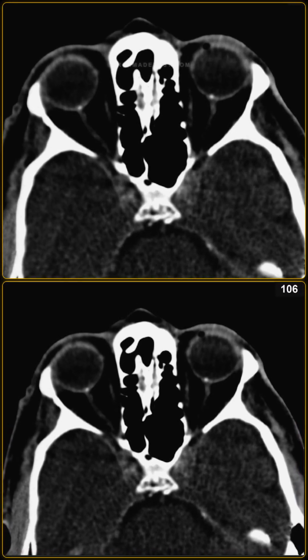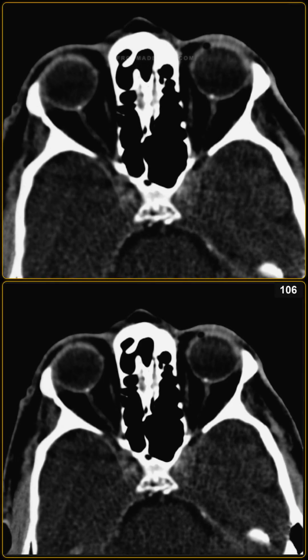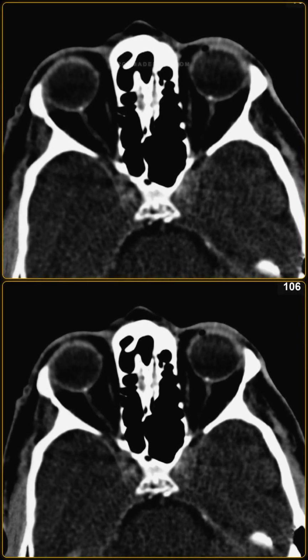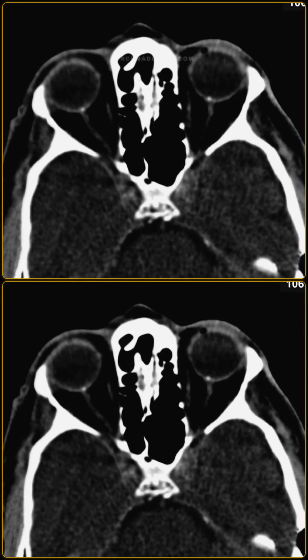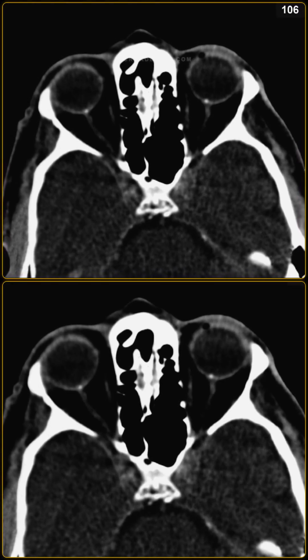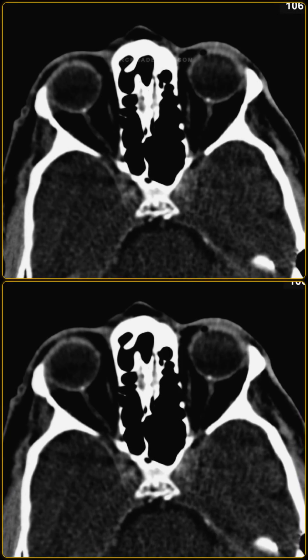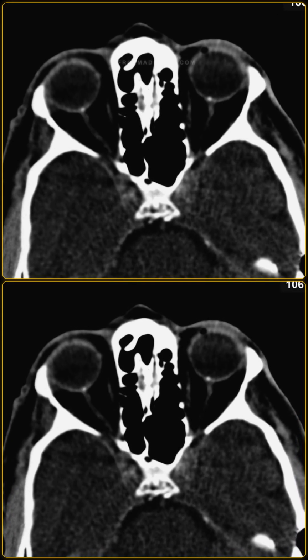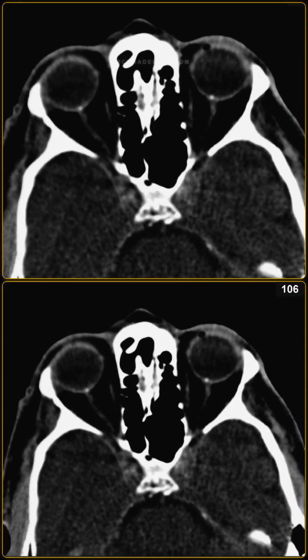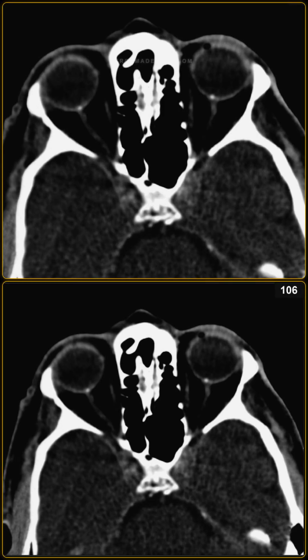Describe the role of ocular ultrasound in this clinical scenario. Ocular ultrasound is highly sensitive and is the modality of choice for confirming optic nerve head drusen. Drusen appear as highly echogenic, calcified foci at the optic nerve head that show persistent acoustic shadowing. Crucially, ultrasound can demonstrate these calcifications even when they are buried deep within the optic nerve head, resolving the clinical dilemma of pseudopapilloedema.